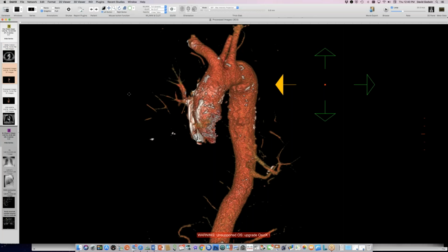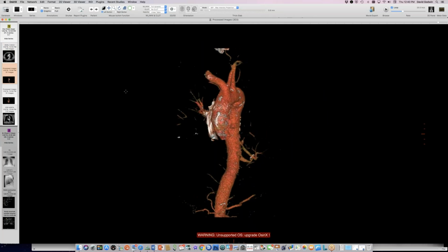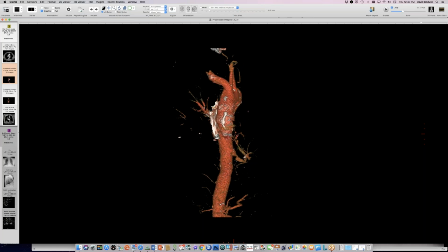I think that people were pursuing the diagnosis of aortic disease here, so we have these very nice aortic reconstructions. I think his presentation probably suggests there could be aortic dissection or something. And here's our systemic artery coming off the aorta going into that thing.